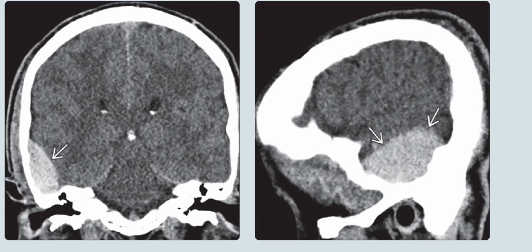Left is the coronal scan reformatted from the axial data, and it is nicely demonstrating the classic middle cranial fossa acute epidural hematoma. Right is the sagittal non-enhanced CT scan, which is reformatted from the axial source data in the same patient, and it shows the classic biconvex configuration of the acute middle fossa epidural hematoma, and it is present in all the three major imaging planes.